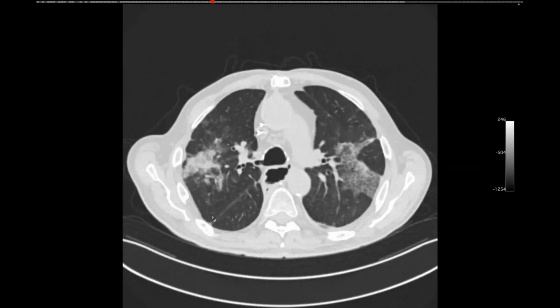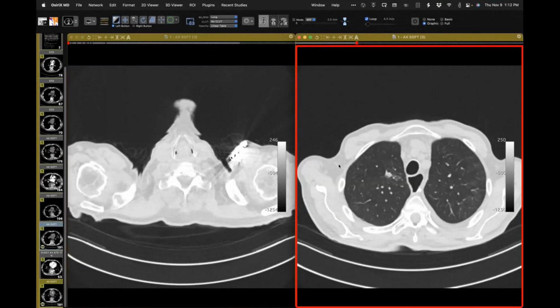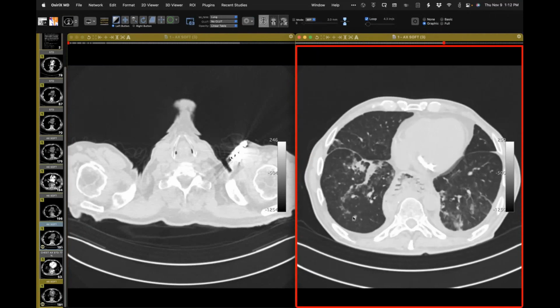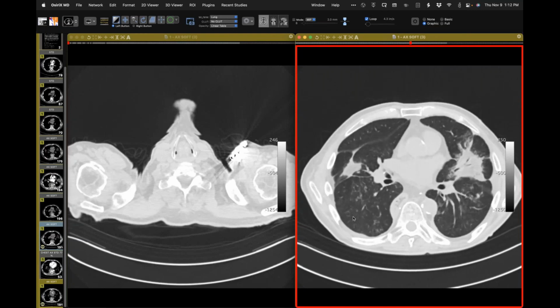But it usually causes more distortion, and that can be a clue compared to other things that are more filling the lung. You see it looks more distorted in your case, but that's a great example. Very good.